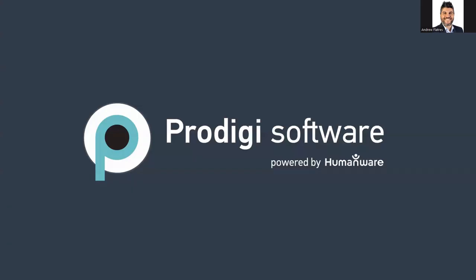Today's session is an update webinar, if you will, to show the new functionality in version 1.5 of the Prodigi software, which we're really, really excited about. It actually went live late yesterday afternoon here on the East Coast, about 4:30 p.m. Eastern. We will be spending most of the time showing the new features that have been added.